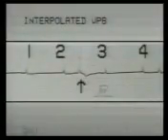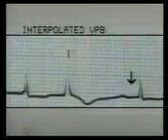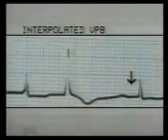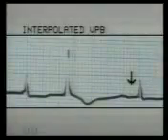But here, the ventricular premature beat has occurred so early that it did not affect the AV node, which conducted the normal beat as usual. This is called an interpolated ventricular premature beat, usually seen with bradycardia. The only effect that it has on the next beat is that the PR interval is prolonged, delaying the QRS complex slightly. Otherwise, the sinus rhythm is undisturbed. Note the prolonged PR interval in the succeeding beat.